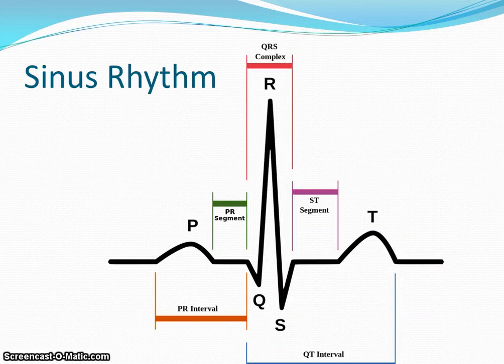To identify sinus rhythm, compare the shape of the heartbeat to the next and surrounding beats to note differences and recognize shape similarities and contrasts. Determine whether the atrial and ventricular rhythms are producing a normal deflection and ensure they aren't too fast, slow, missing, too many, or too few.